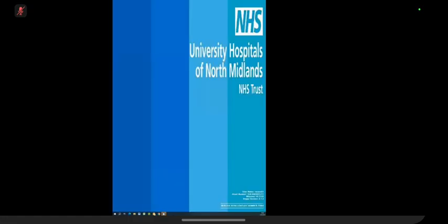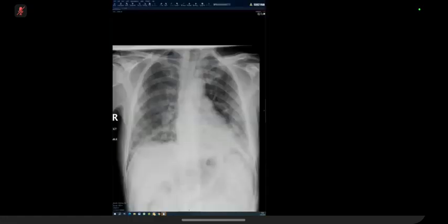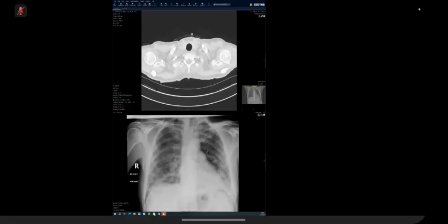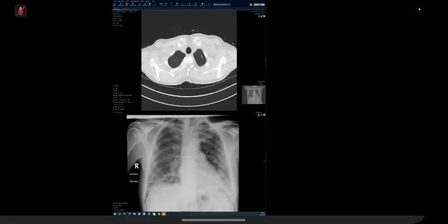So you're suspicious for pneumonia? Pneumonia or multiple nodules in the lower lungs. Okay. So the patient is well, they only have a cough. What kind of pneumonia do they have? If the patient doesn't have fever, then it doesn't go well with pneumonia, as pneumonia causes constitutional symptoms. What other kind of process could cause this appearance without giving the patient a fever?